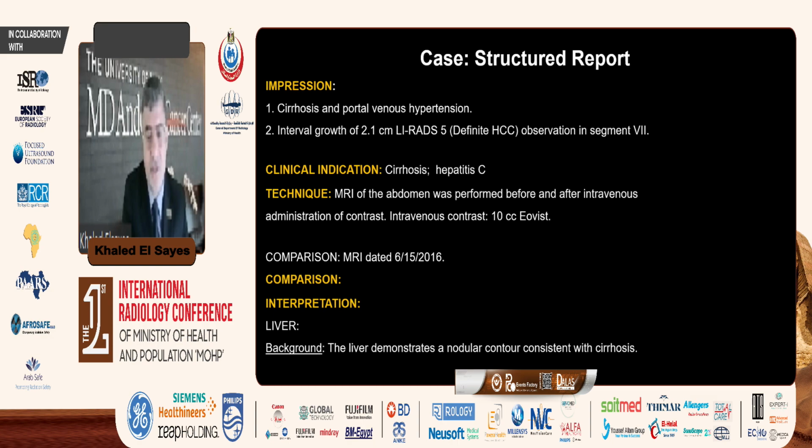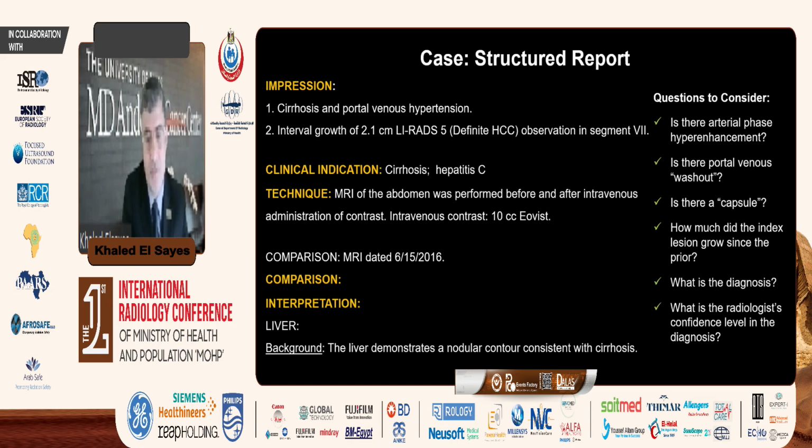So the same patient with a different reporting system. This is a structured report, and we developed this in the LI-RADS group. And here you're telling the non-radiologist colleague definitively what you're thinking about. You're thinking about cirrhosis, portal hypertension, and then you're describing clearly these major features in the report. Here I'm going to show the report, but this is your impression. You're telling them that you're dealing with a definite HCC observation, and you're localizing the segment, and you're telling them exactly what you feel. So this is the structured report and how it looks like, including even the clinical indication.